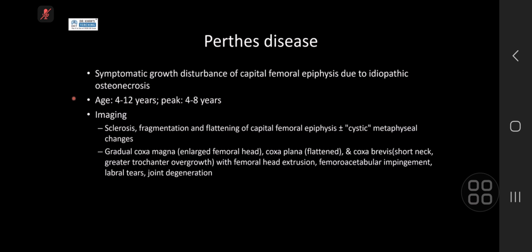Or is it fragmentation of the trabecular bone? Is it some deposition of fibrous or fibrofatty tissue or granulation tissue because of that altered blood flow within the hip joint? The cool thing is these are actually not very rare, and in the literature it's reported that they are seen in a delayed phase of Perthes disease. So it could help you to say this is Perthes disease, to be quite confident. But of course, take it with a pinch of salt, and always correlate with the clinical history.